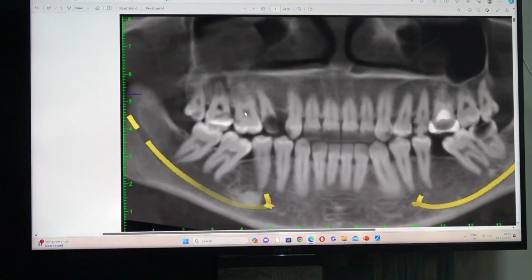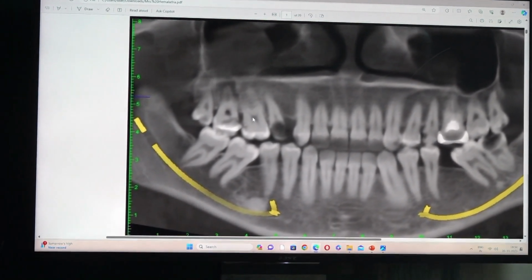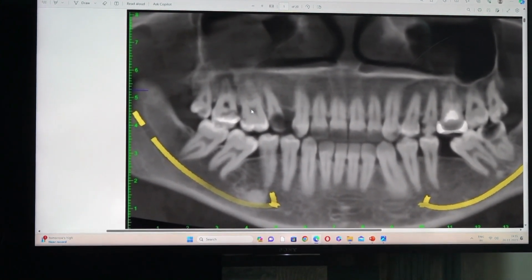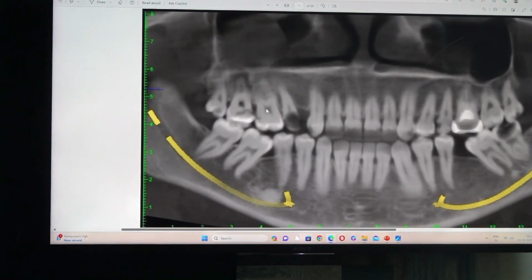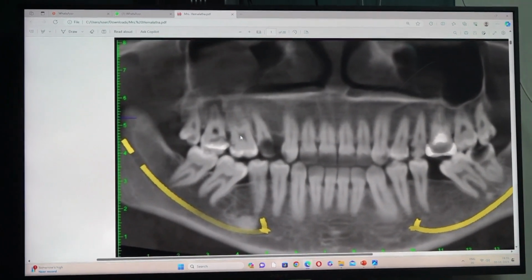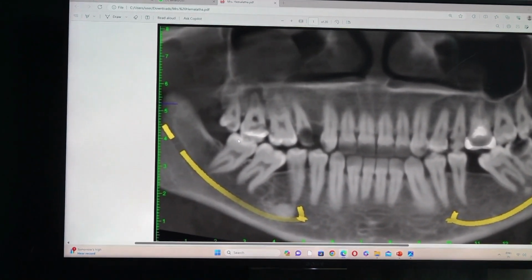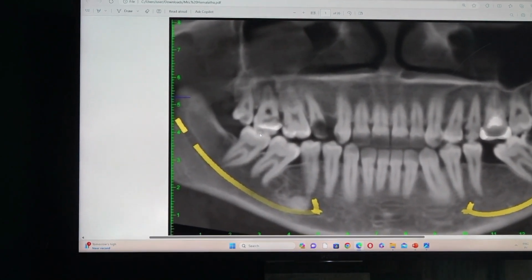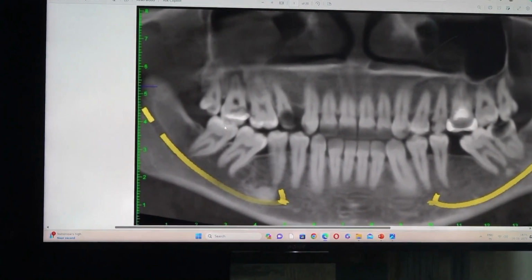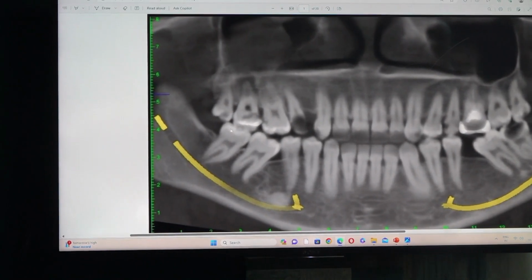Okay, leave this thing. So the tentative plan by the doctor is 1-5, 1-6, 1-7, 1-8 extraction and whatever number of implants. So how many implants? Say 3 or 4 implants. The main thing is 4-8. The 4-8 plane is very much upward, right? So both in centric occlusion and protrusion, this 8 distal cusp will give interference. So better to remove this 4-8 or do enameloplasty.